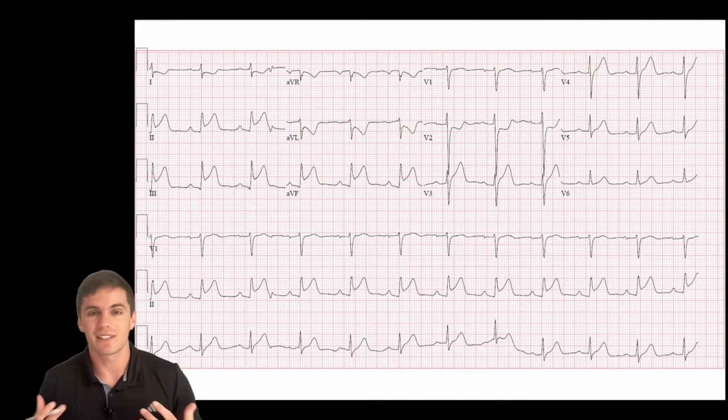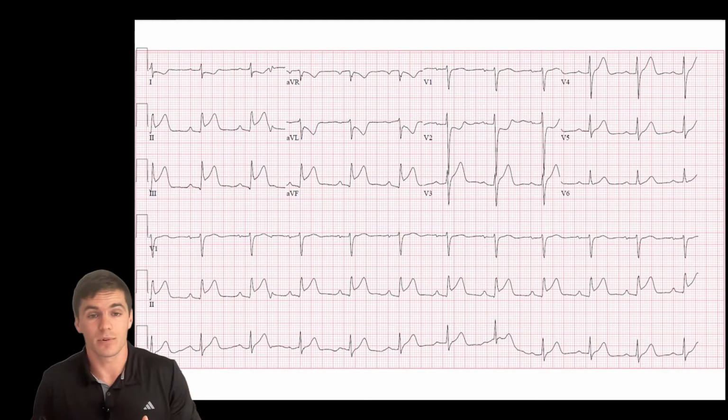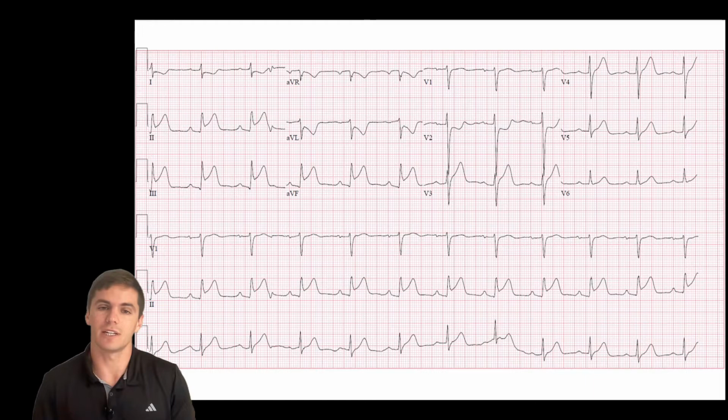My name is Reed and we have an exciting lecture today about myocardial ischemia and infarctions. We're going to talk about ST segment elevation, ST segment depression, the anatomy associated with those in each of the leads so that we can determine where that ST depression or elevation is representing within the myocardium. So stay tuned. By the end of this lecture, you're going to be able to take a look at ECGs just like this one and say with good certainty what's going on and what needs to happen next.